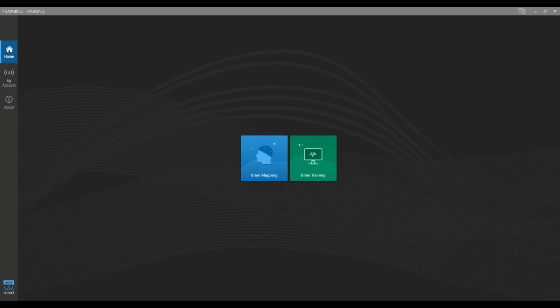So maybe we've got their target percent set too high. Maybe it's just that area of the brain not ready to respond yet. So if I had that same situation but a low training efficiency, that's when I would get worried, and want to look into it farther and make some changes.